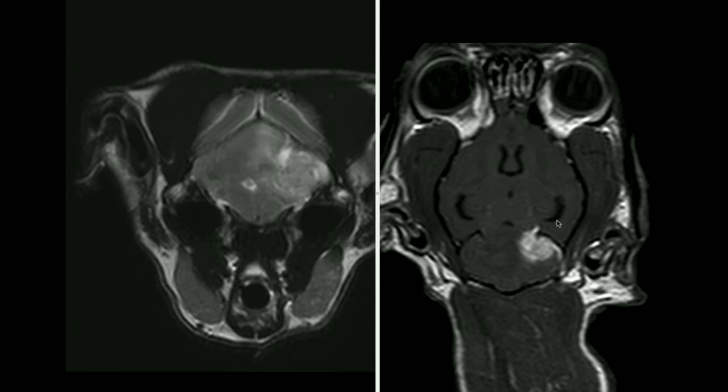The lesion shows primarily characteristics of an extraaxial location. We can see here it's broad-based and peripheral in location. It has a dural tail sign and dense, relatively homogeneous enhancement. These are all features more commonly seen with an extraaxial location. There does appear, however, to be some invasion of the parenchyma. On the T2 weighted images, we don't see any inward displacement of the grey matter, which would often be seen with an extraaxial lesion. So whilst it's predominantly extraaxial, there does appear to be some invasion of the neuroparenchyma.